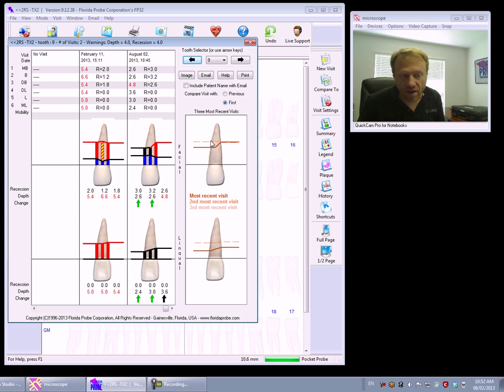The second line there is more dotted or more faded, and therefore it's the older of the 2 lines. It will record up to 6 visits total and be able to display that here, and the example here where we're going to show the overlay will actually show you the last 3 visits. So obviously today was the second chart. We only have 2 charts in here.